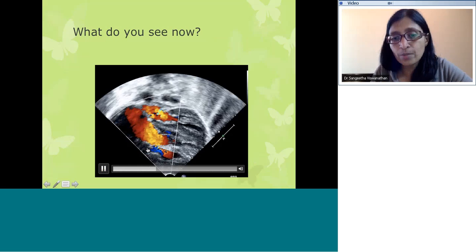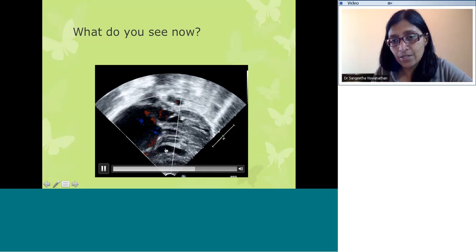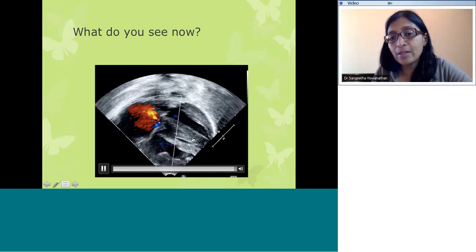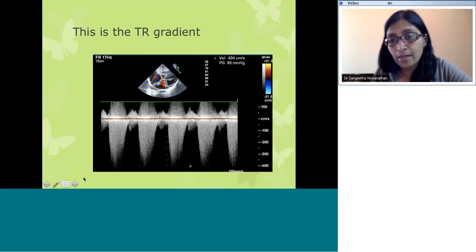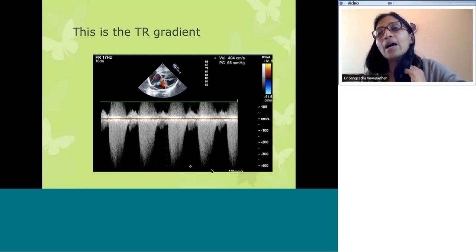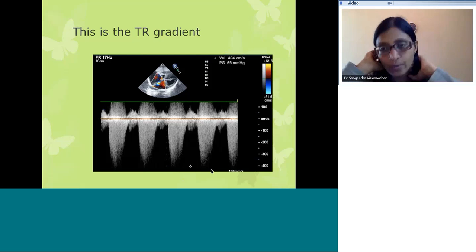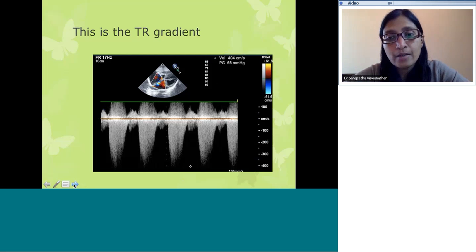Then you look at the 4-chamber view. You say RA, RV dilatation, and some TR, right? So relatively the LA and LV look quite small and underfilled. TR gradient is 65. Okay, so there is pulmonary hypertension. Usually in supracardiac TAPVC, when there is a greater degree of pulmonary hypertension, what will you suspect? Obstruction.